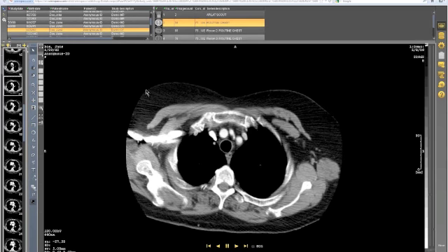So I'm going to go ahead and pause that. Now, one of the nice things is that in RemotePACS, the accounts are free, and you can upload up to 15 studies of your own to play with. Plus, we give you all of these demo exams also to play with. So you can come in here and play with these tools and see that they really are very easy to use. They're all standard tools that people need in order to do a viewer. And I had mentioned earlier, this is FDA approved. It's fully diagnostic.